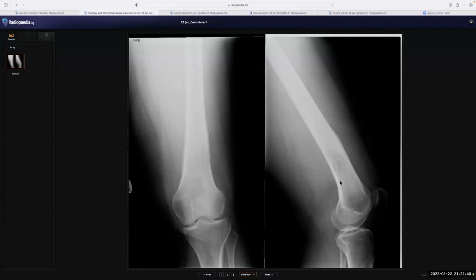On the lateral view, it is predominantly intramedullary, and I don't see any associated soft tissue mass. Predominantly it is a lytic lesion, no chondroid matrix. To me it looks like a wide zone of transition rather than a narrow zone. So it looks like an aggressive process, although I can't identify any associated periosteal reaction or soft tissue mass. The rest of the visualized joint spaces are intact with some moderate degenerative changes and no joint effusion.